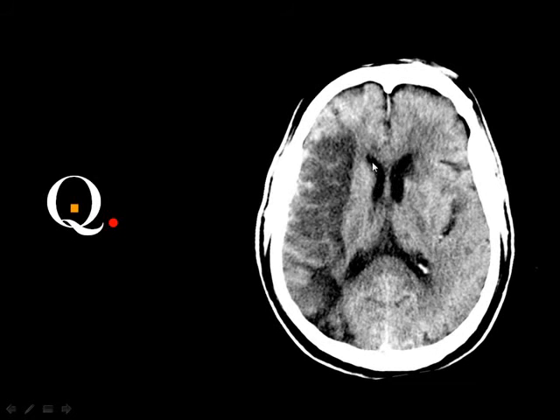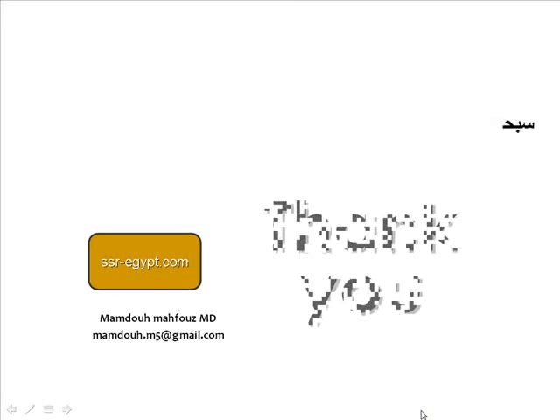Okay. Now, compare this ventricle with this one. What do you think? Compressed, yes, this is acute. Then can you see some bright foci inside the infarction? Then you are dealing with an acute hemorrhagic infarction.